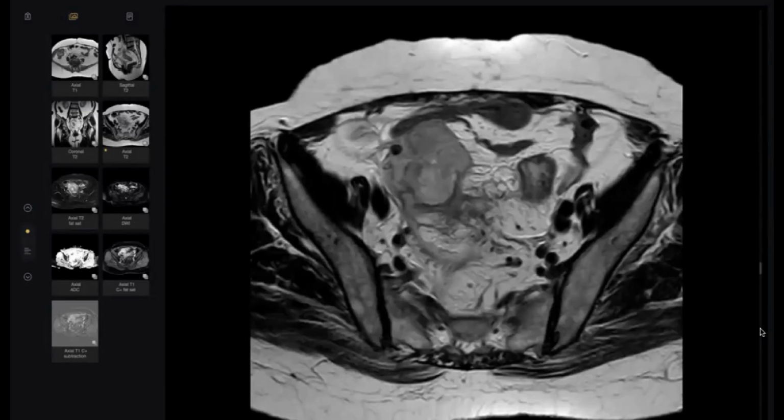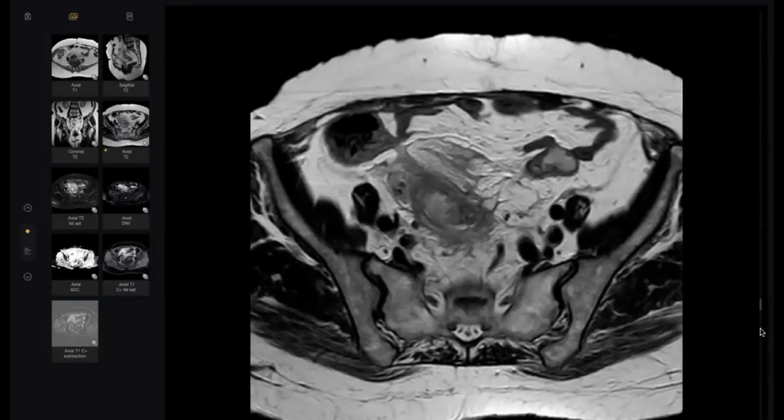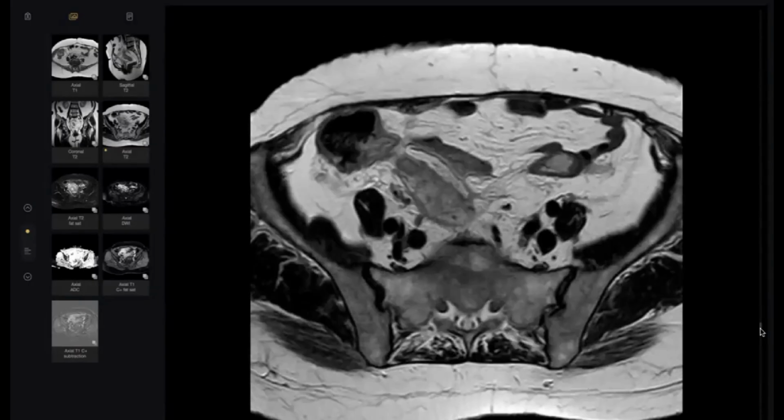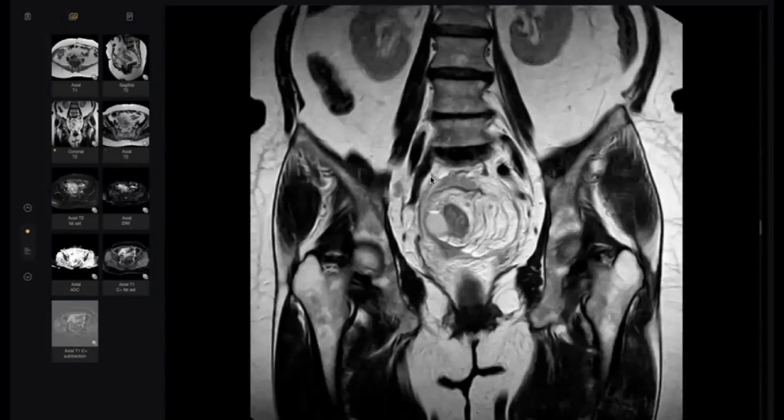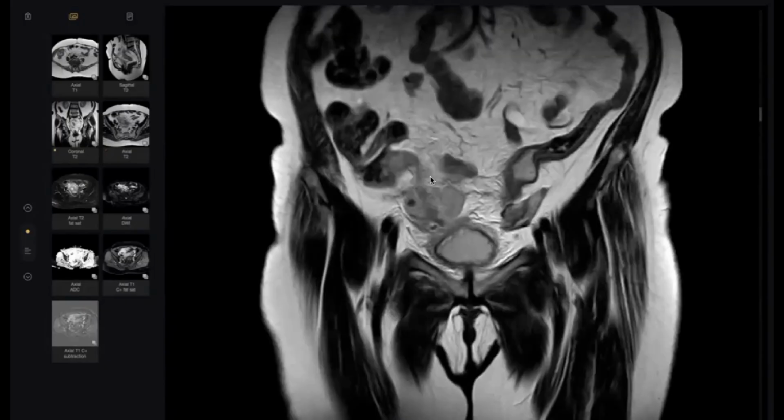I do not see any significant. Stop here, doctor. What happened? Tell me. So could this be a case of early ulcerative colitis? One second, doctor. Look here. What happened here? Tell me.